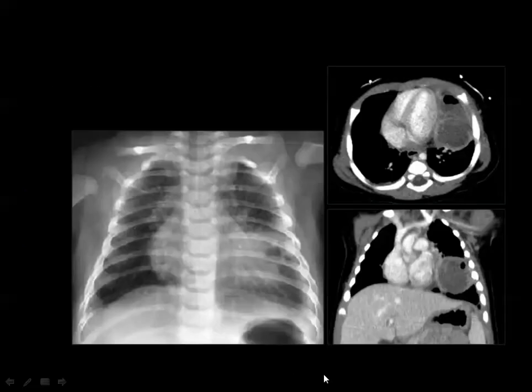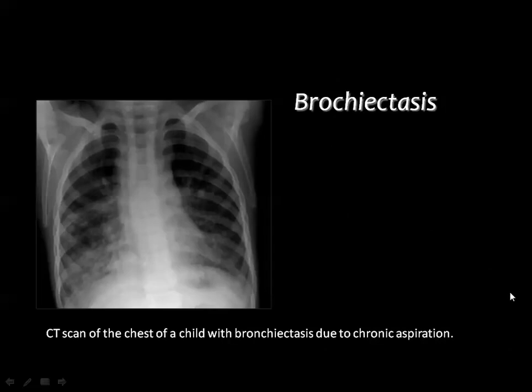And this is an example of a lung abscess by chest X-ray and CT scan. You see that the abscess is a well-defined lesion with a thick enhancing margin located within the lung, and it may show some air loculi or an air fluid level. Otherwise, the possibility of an infected pneumatocele is favored rather than the development of a lung abscess.